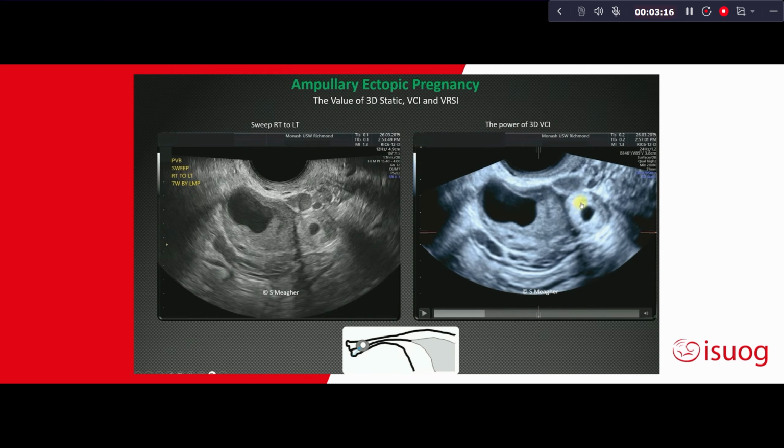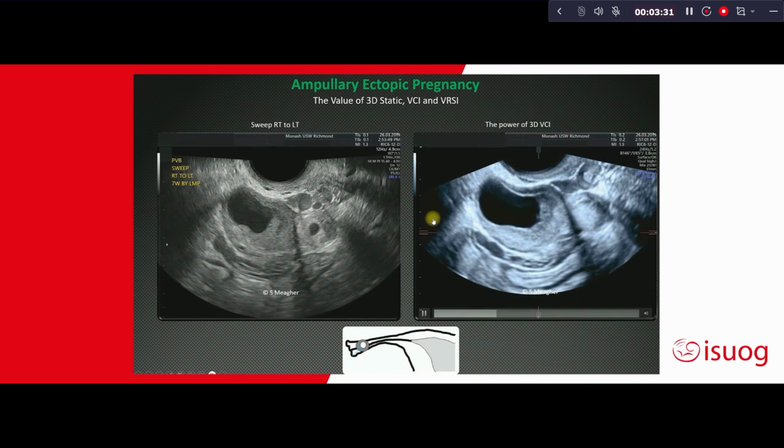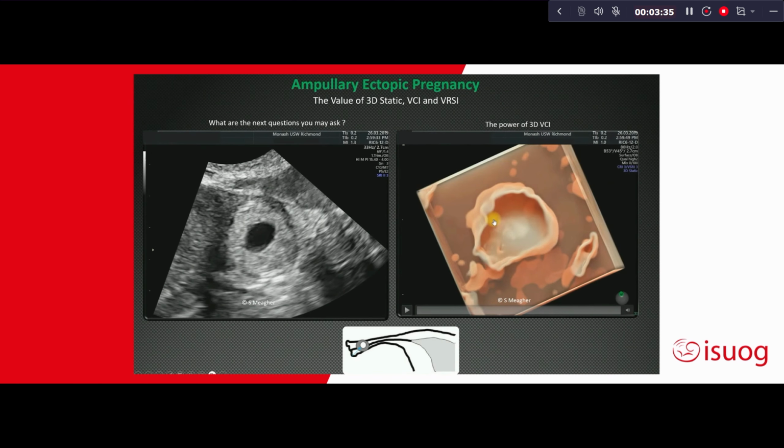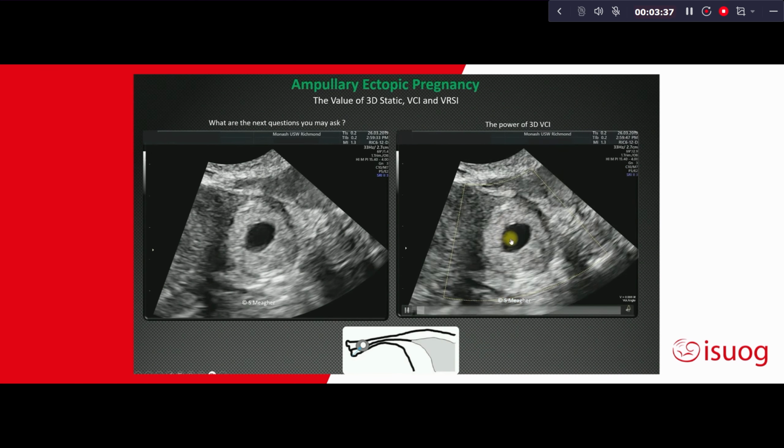3D, in fact, becomes a very powerful tool in distinguishing the exact location of trophoblast, and I will make reference to this throughout the talk today. Compare the trophoblast ring here on 2D, which is indistinct, and clear, as it is demonstrated here on 3D evaluation. So 3D doesn't always necessarily mean rendering, as is demonstrated here.